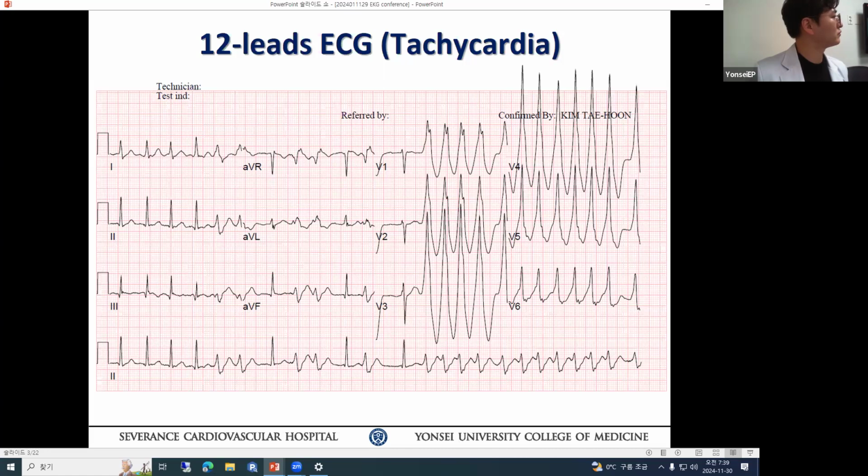That's one. Second is that as he pointed out, when you read the ECG first try to look at the P wave. Is there any P wave evidence? No. The continued variation of ST segment, PR segment, then RR interval slightly irregular. That's in favor of atrial fibrillation, for some sort of multiple atrial activity. Okay?